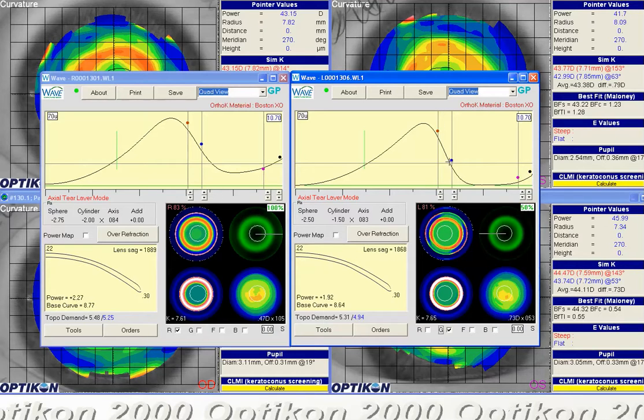right now you're at 6.2 and 6.8, so I'm going to reduce this to 5.6 and 6.2, and this will be in the horizontal meridian. 5.6. And 6.2. And now you can see our vertical oval, where horizontally we have a smaller zone, vertically we have the same treatment zone as before, and then the oblique meridians are in between. Now we want there to be about a diopter difference, and we're right about there.